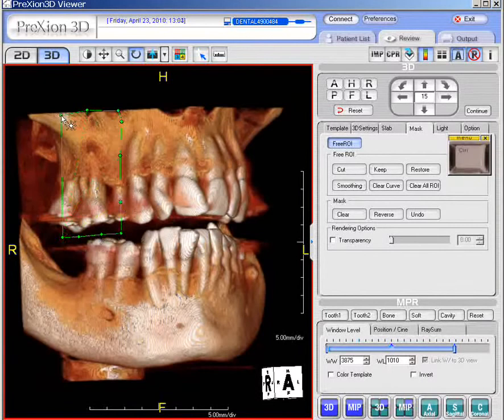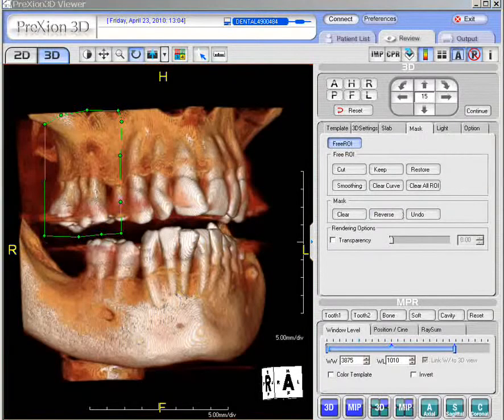And just kind of clicking with the left click of the mouse, okay, and you can even extend out a little bit by grabbing one of the green dots and moving in this direction here. Okay, then you can release the control key.